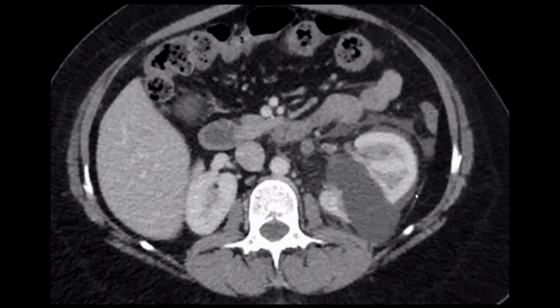What is the cause of the renal vein thrombosis here, and what is this mass? This case is breast cancer receiving chemotherapy, and once we have malignancy, and also chemotherapy, there is a high risk of hypercoagulability status, and this case is venous thrombosis secondary to the malignancy status of the patient.